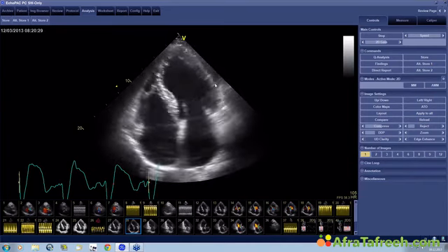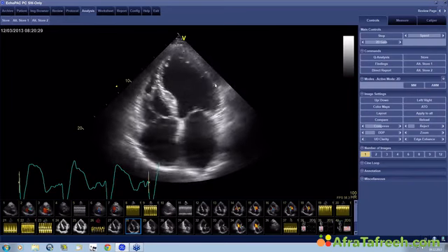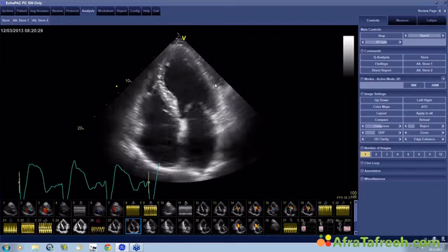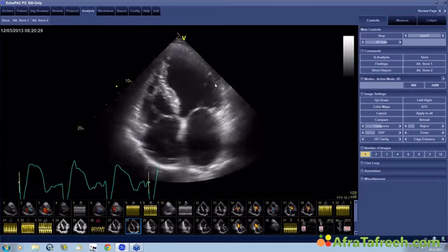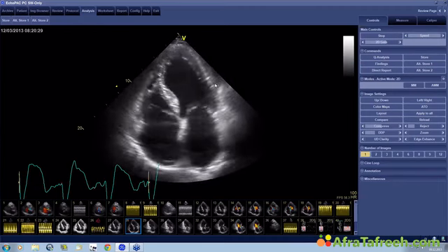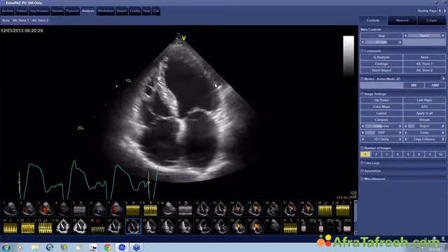Okay, now there's been a big issue of the role of echo in patients with dyssynchrony, and are we actually able to detect the patients who really need CRT therapy or not? The problem was that many people that got this CRT system, which is fairly expensive, did not benefit at all.